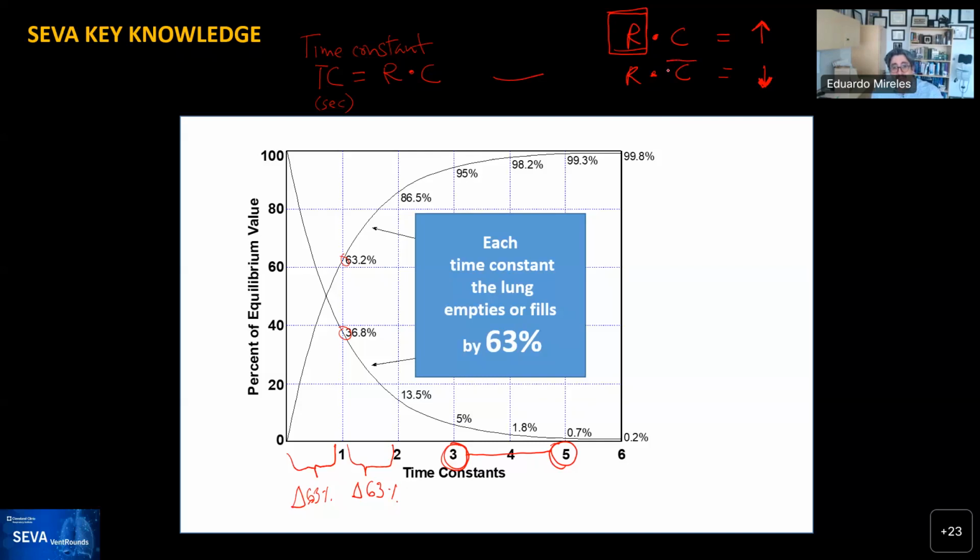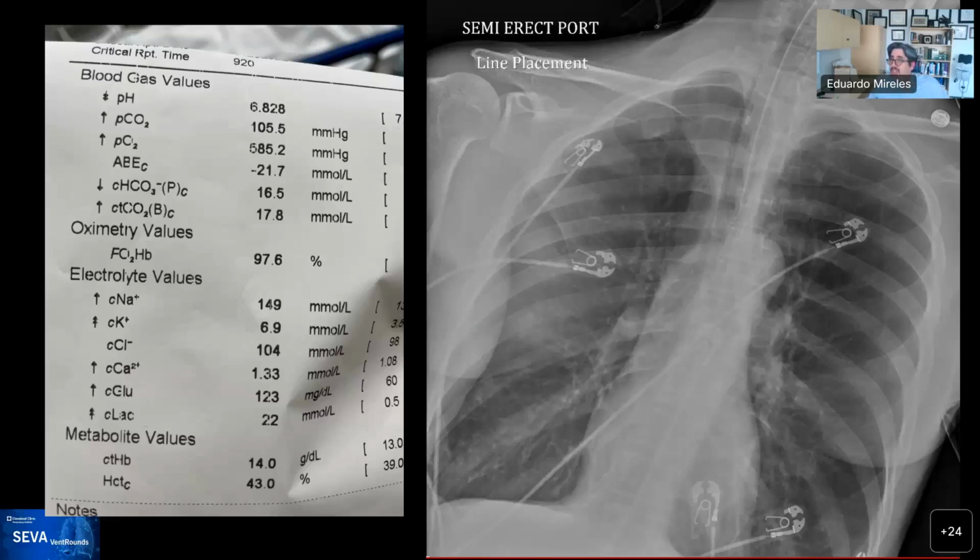I thought I would show a couple of examples just to get your brain activity going. What you have here is very recent, the pH of a patient, and you can see the amount of CO2. This is a different patient, but all in the same week. You can see the size of the lungs really increased in this individual. You can see essentially every single rib space. The diaphragms are all the way to the base and pushed down, with a heart that is just hanging in the middle, with an ET tube in place.